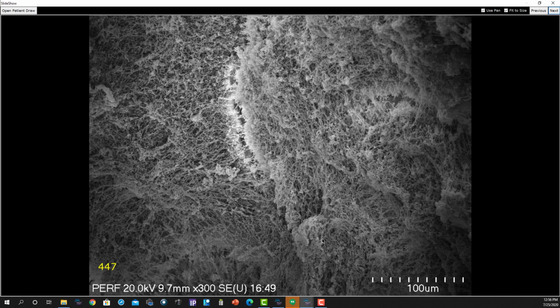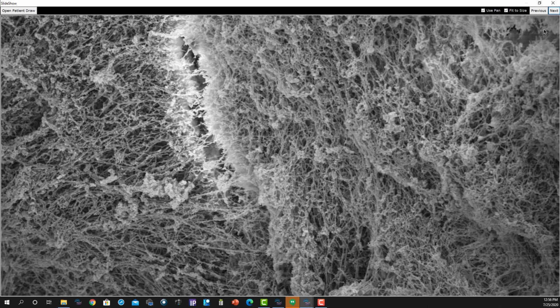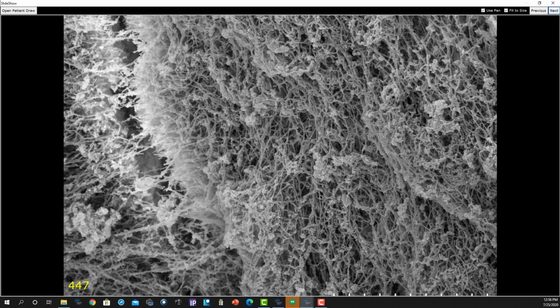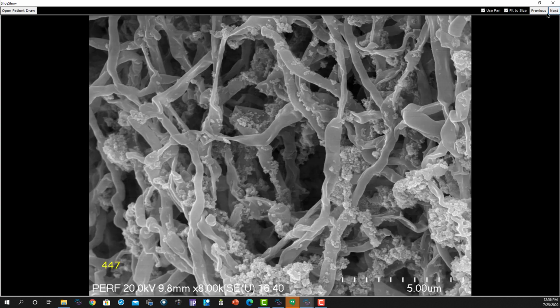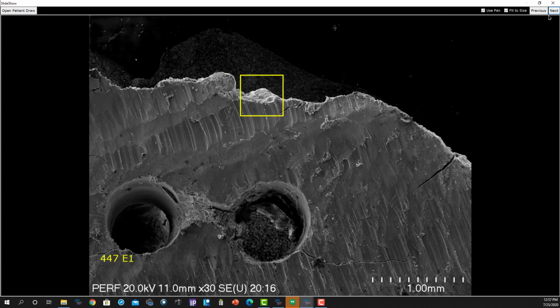And here you can see all of this lacy material, which looks like a Fusobacterium nucleatum type of impregnation, or a fungi. When you go in here and look very carefully, it's a classic biofilm. And these are some of the organisms; this does look like Fusobacteria.